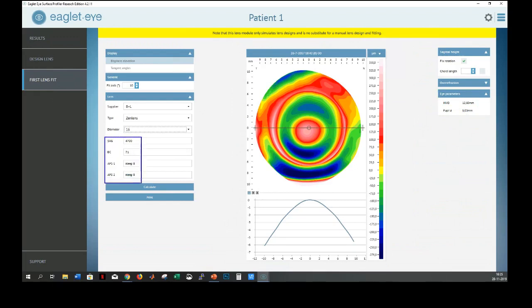The algorithm itself has been returning these values, so a sagittal height of 4,700, so you do not have to include any more settling or apical clearance. The recommended apical clearance by the lab is used to calculate what will be the best lens. So it might be that the lab is recommending 300 microns, but you feel I need to take care of oxygen, so I want to go to 200 microns of apical clearance. At that moment, you may decide I will go for 4,600.